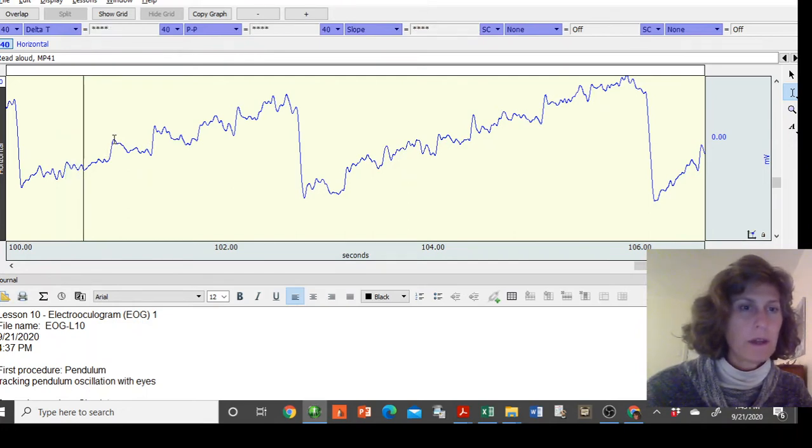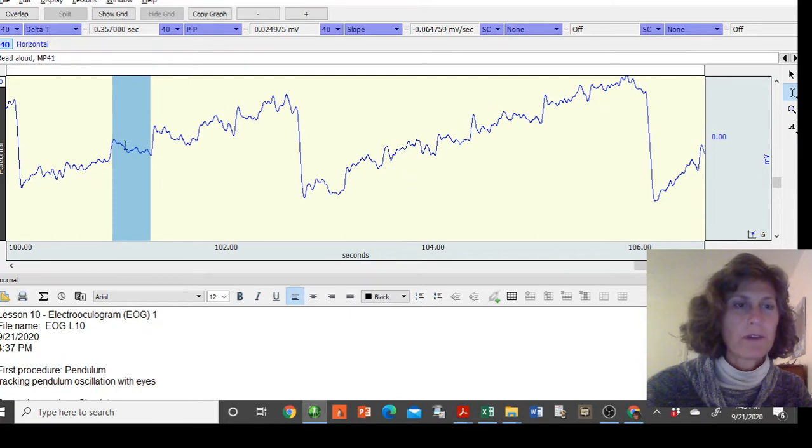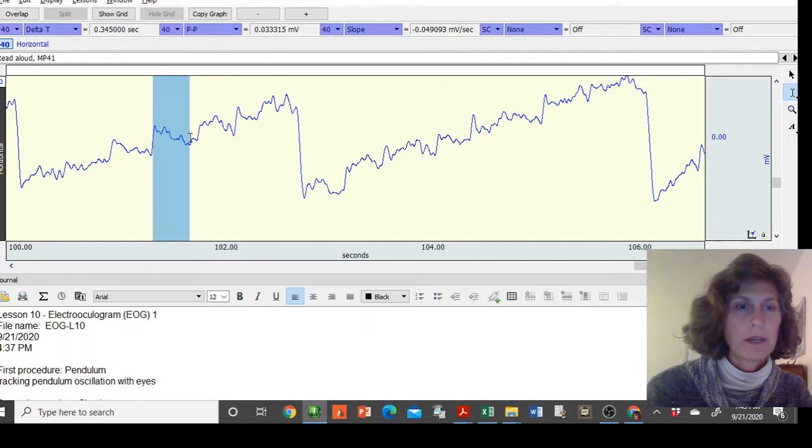and I think you've gotten the point by now, if you've been listening and watching, that this is not an exact science. It's not clear what is a saccade and what isn't, and what was exactly like moving from one batch of words to the next. But again, you're doing your best. What's interesting is this is the actual eye movements as they went.